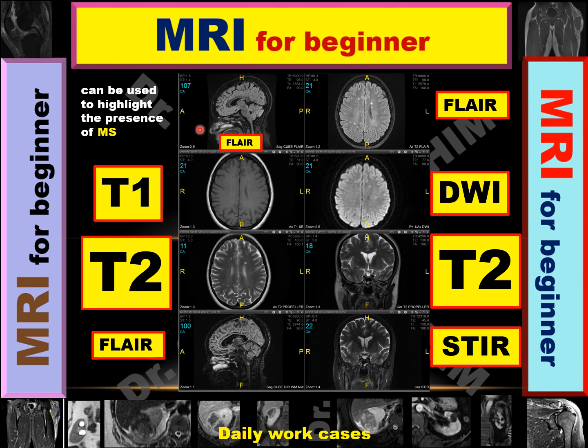Also, in the FLAIR image, we can diagnose MS clearly. If we compare with the T2 here, we can detect the abnormality like this focus and this focus of high signal representing plaques of MS. However, in the FLAIR image, it appeared clearer because the background is black. So the white dots appear clearly, so it's more sensitive for diagnosis of MS plaques. We can also diagnose other plaques, like these plaques in the proximal cervical spine.